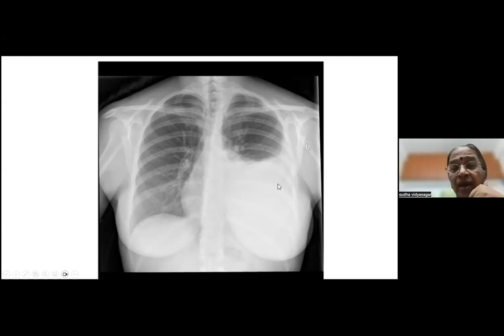So you should think that, oh, okay, there is an effusion. Is there a consolidation with an effusion? That we don't know. Or it could be just the effusion and it's not very shifted. It's not, of course, massive. It's somewhere around moderate. But because of this uptick here, we should think that there is a fluid there.